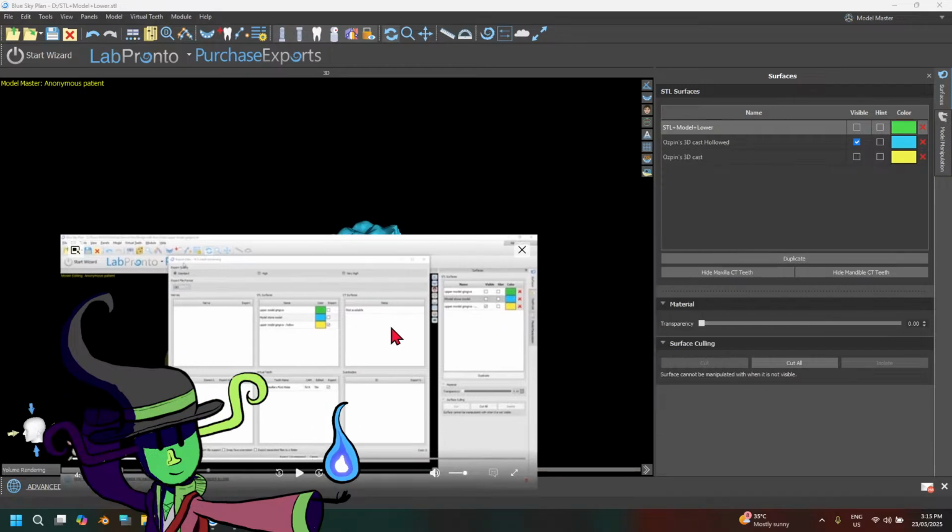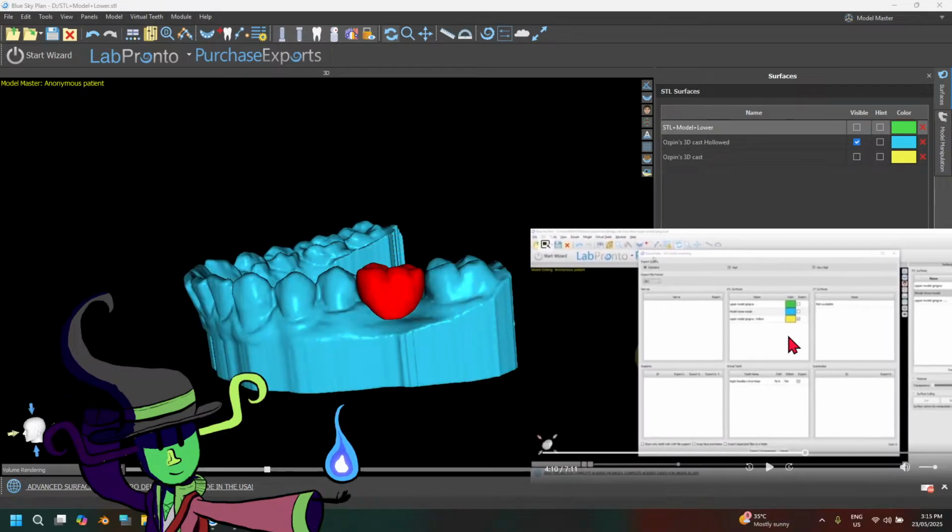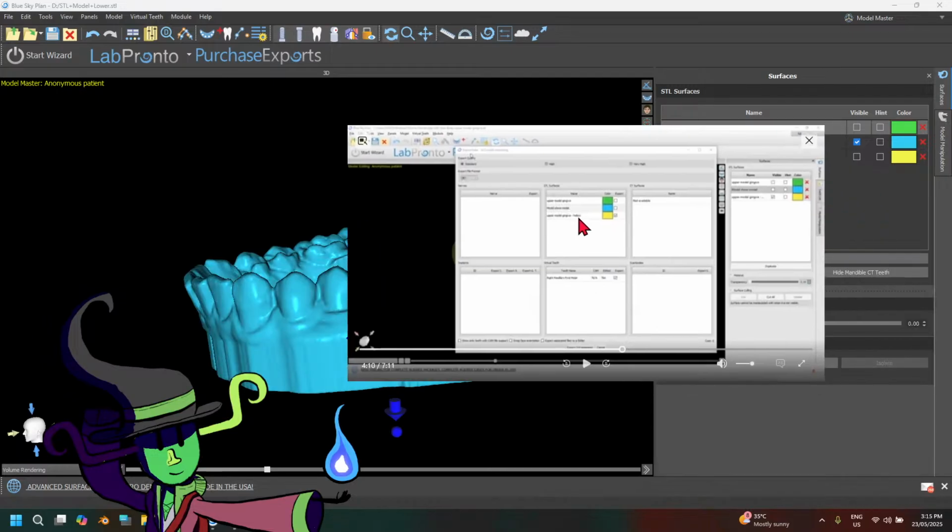Speaking of which, where is the tooth here? We added in our recent versions the ability to export to OBJ or STL. For all intents and purposes, 3D printers accept both of them and can print both of them. We added OBJ because OBJ actually includes more information in the file, kind of like a higher version of the STL file that includes more data. So we could select either one. Printers can receive OBJ and print with OBJ.